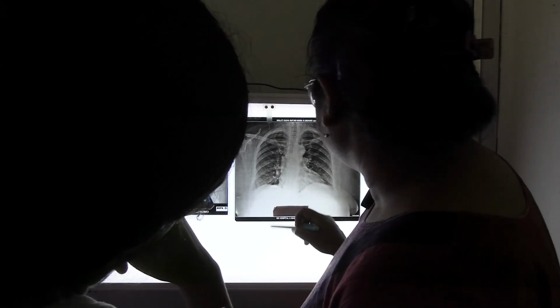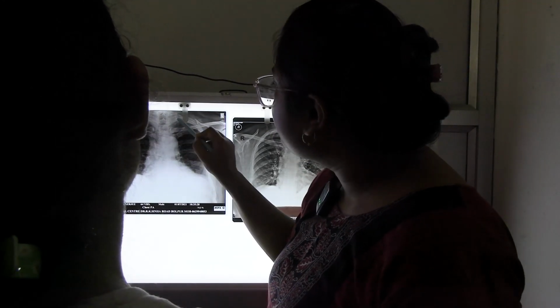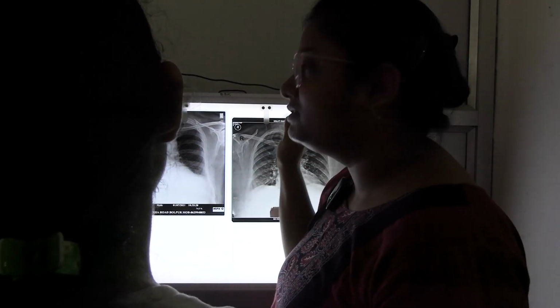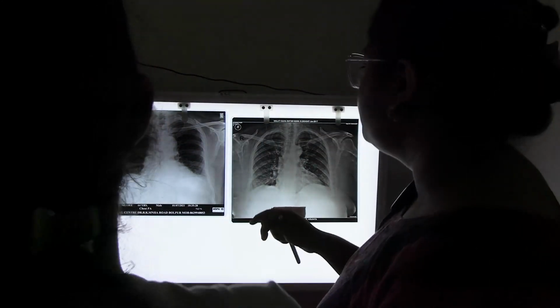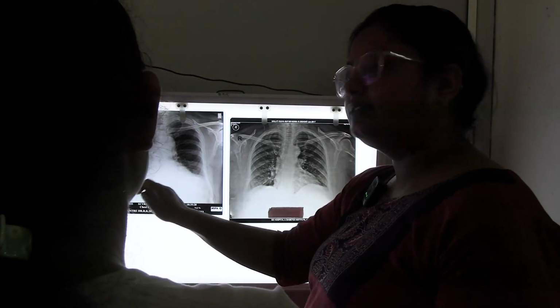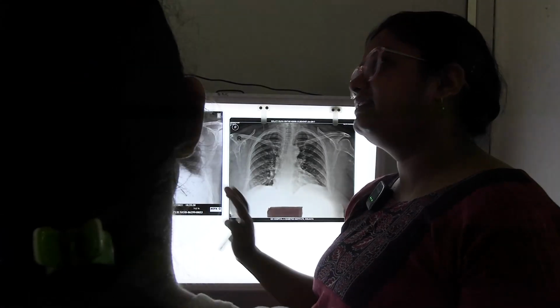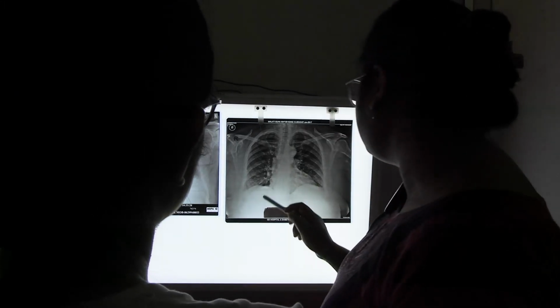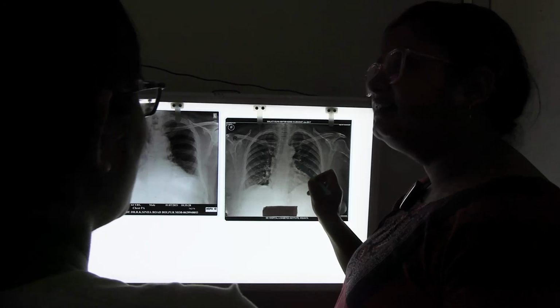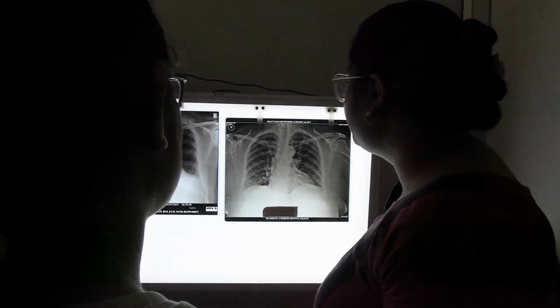Here also you can see, and this is the first rib. So, above the first rib will lie the apex of the lung, which is covered by the Sibson's fascia. These angles are very frequently given. See, these arrows are showing these angles. And their clinical aspects and different things will be asked in your OSPE. Here, this arrow is showing the aortic knuckle, and related questions will be asked from there.